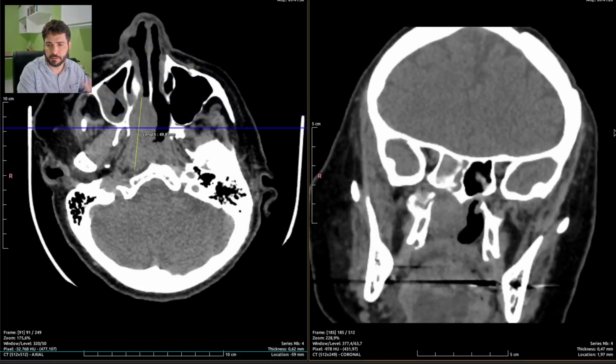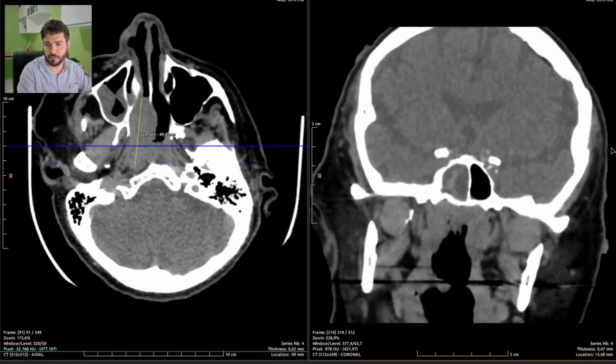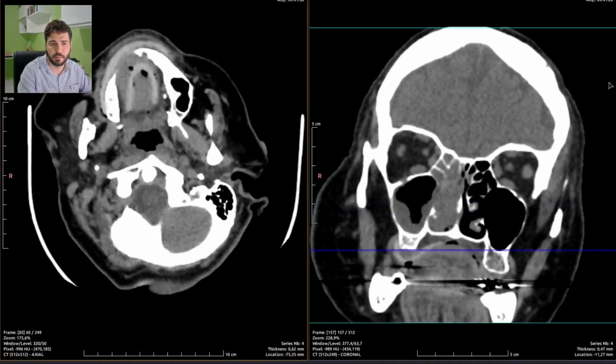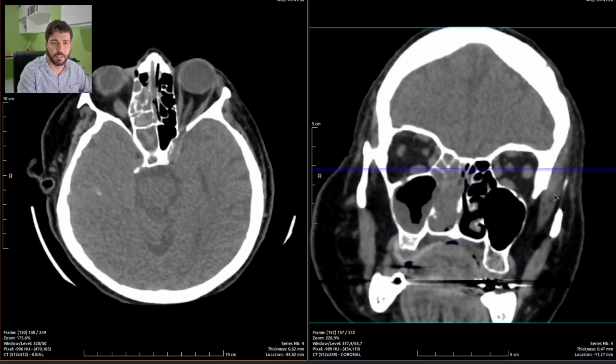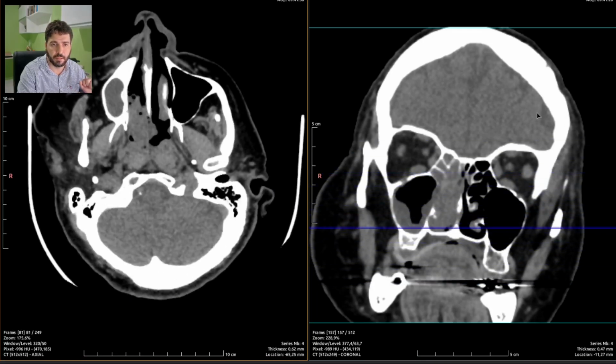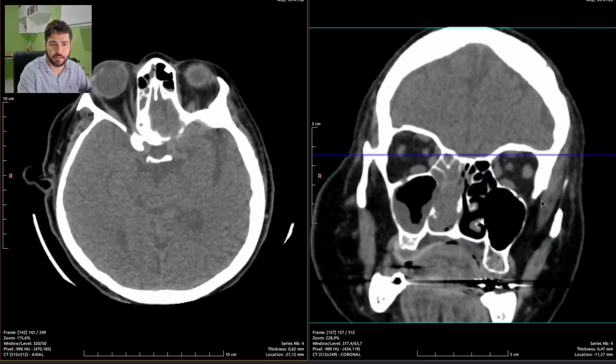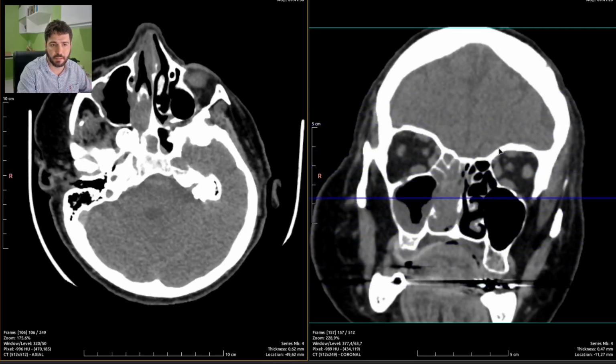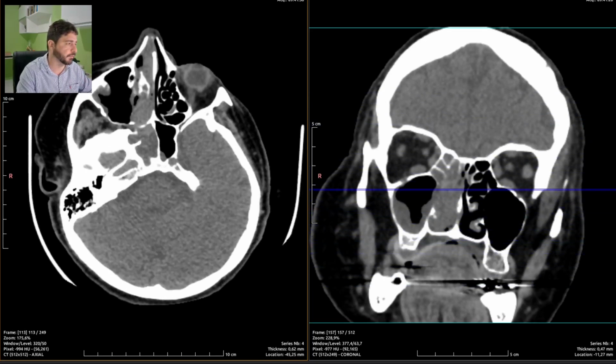This single description is what we need to really summarize the major concern of this case. So now I'm going just to add on the other signs of sinusitis and secondary disease, and we should be done for today.